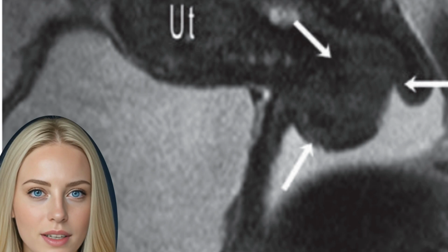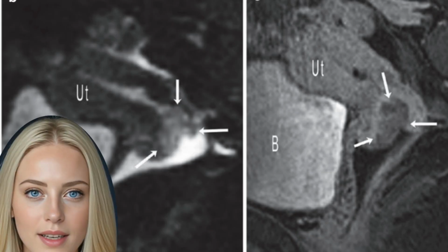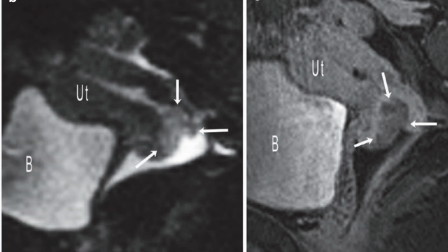dating to a CT examination, is not used for local staging. However, it is used for radiation planning or for complete staging for distant metastases, especially pulmonary, hepatic, retroperitoneal lymph nodes, performed for another indication. An endometrial cancer appears as a hypodense mass in the endometrial cavity.